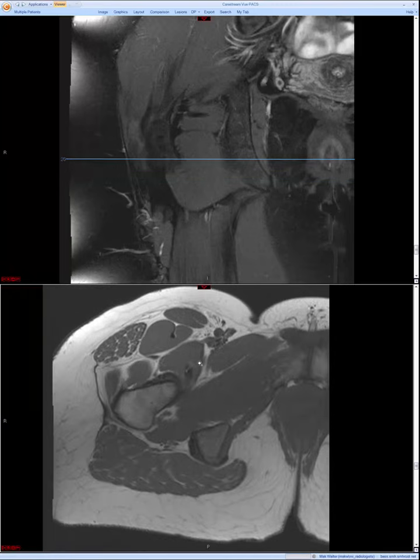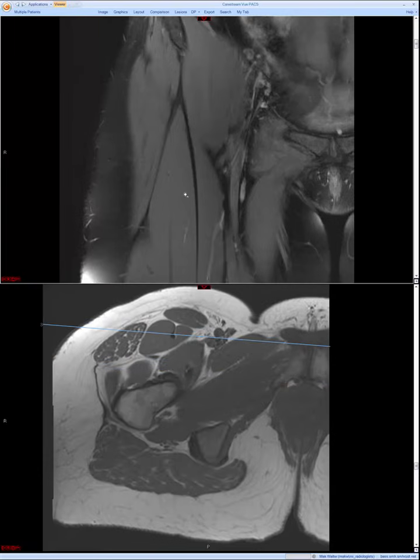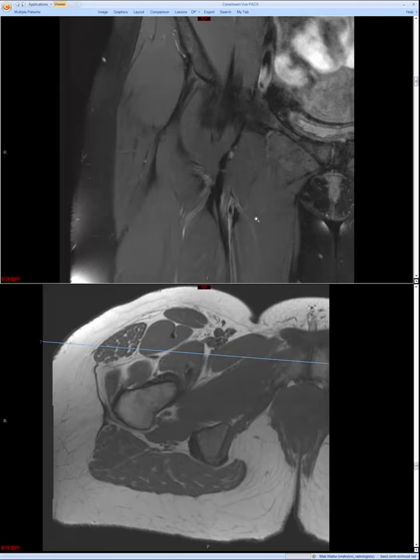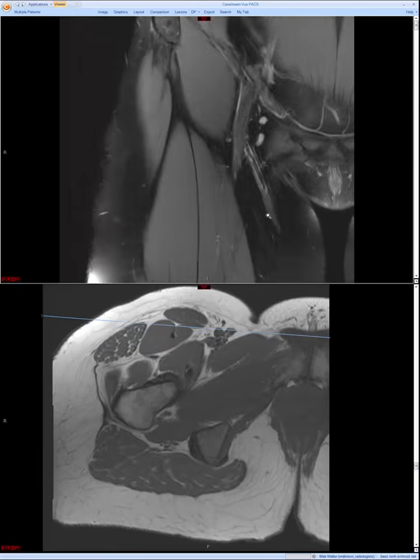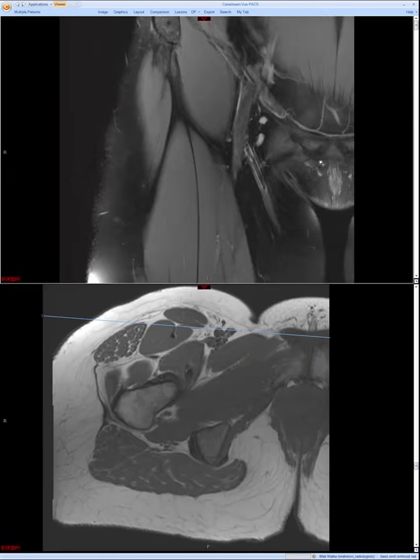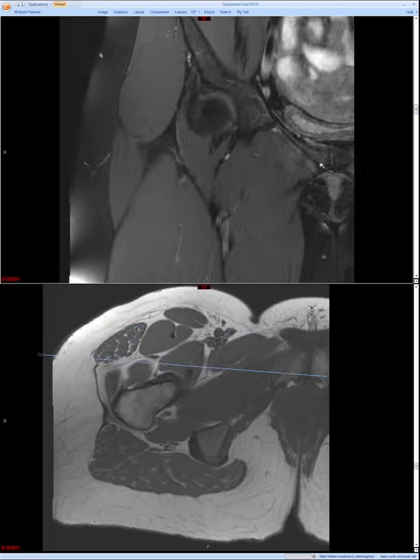So moving right along, now we're just kind of going by process of elimination here. There's actually, or there should be, a dedicated protocol performed if the query is osteitis pubis, athletic pubalgia, sportsman's hernia. That actually shouldn't be a hip MRI at all, but it should rather be a focused MRI centered on the symphysis pubis. But unfortunately, sometimes you get a vague history, and also unfortunately, on a conventional field of view MRI, you do tend to see enough of the adductor tendons and origins that I think if there's an abnormality there, it should at least be commented upon, and the reader should be directed to pursue a dedicated parasymphyseal MRI.